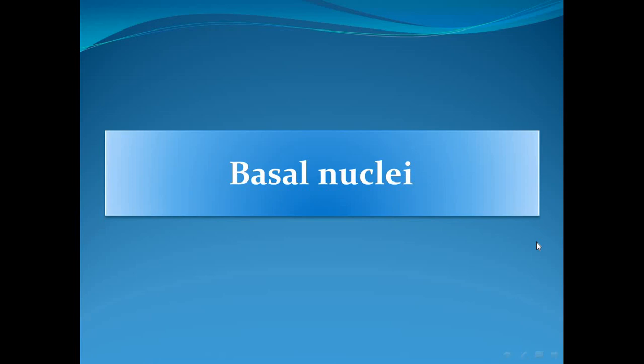So, welcome again to our course of medical imaging anatomy. We will be continuing with the brain imaging anatomy. Today we will discuss the basal nuclei, the white matter tracts, and we will discuss about the cerebrum.